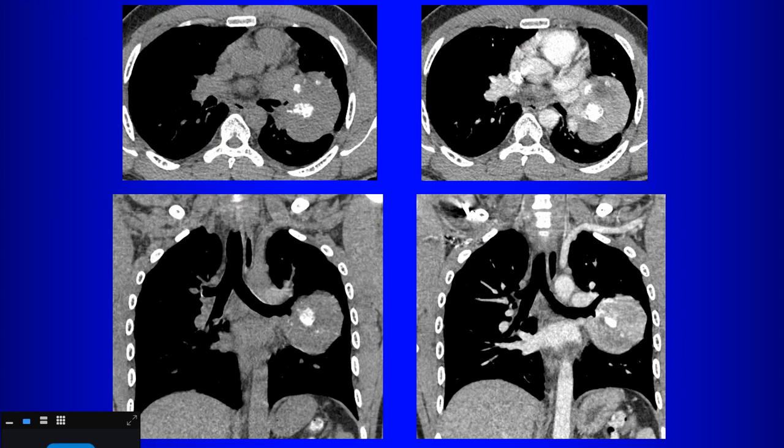Now, certainly, young patients can still get bronchogenic cancer, so that's still in your differential diagnosis. But is there anything else that should be in your differential diagnosis? So you have this large mass in this 26-year-old. What could this be? TB. Infections usually don't give you masses that are quite this large. I suppose there are case reports of that, but usually not so big. Also, what's the difference between the non-contrast and the post-contrast portion?